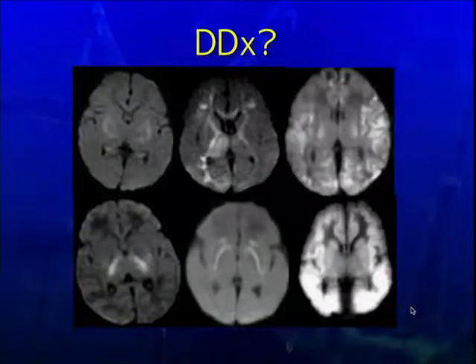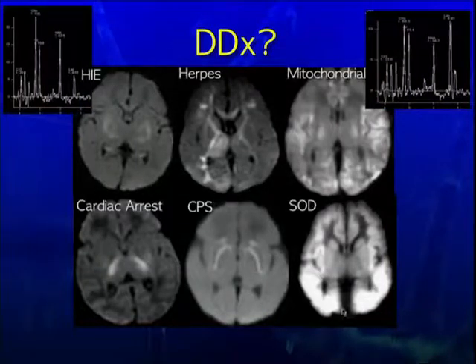One of these is hypoxic ischemic injury. The rest are other abnormalities. This one here was one I showed from the collection before, with a fairly profound hypoxic ischemic event with low Apgars. Standard ventrolateral thalamus, lateral putamen. You see a bit of the optic radiations involved as well. Not infrequently we'll see lactate, and actually more often now in the cooling stage we see a little lactate even when there aren't diffusion abnormalities.